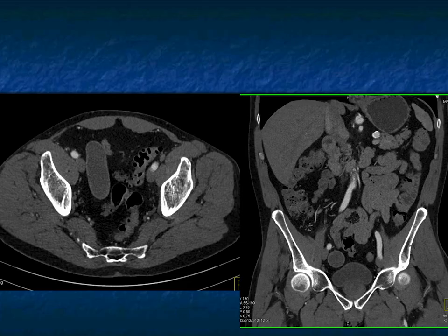Patient with vague abdominal pain, and you see a tubular structure in the right lower quadrant. And here it is in cross-section. Now you could say, well, my goodness, this is a big appendix. And it's in that ballpark of appendix, so it is the appendix. But what gives you such a large tubular mass, but there's no inflammation around it? And this is a mucocele. It's a mucocele of the appendix.